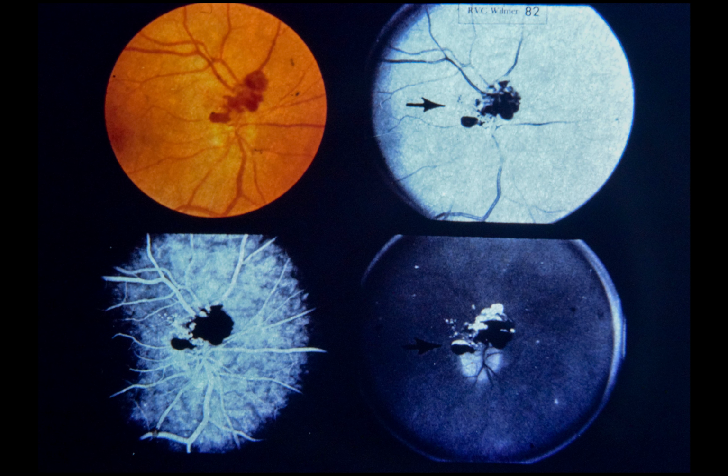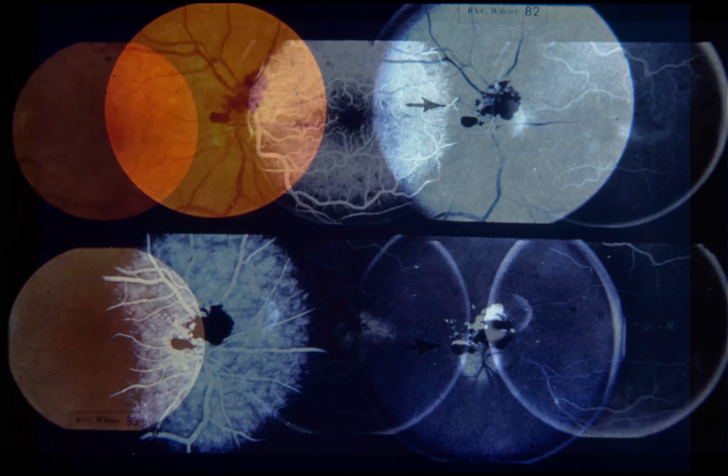It is of interest that she has had several episodes of spontaneous ecchymosis into the right lower lid. Since a number of patients with cavernous hemangioma of the optic disc and retina have associated vascular abnormalities in the skin or brain, the spontaneous ecchymosis in this patient may reflect bleeding from a vascular malformation in the orbit. Angiomatous lesions in the retina cause visual disability only rarely, so that no treatment is recommended. It is interesting to follow the lesions with serial photographs.